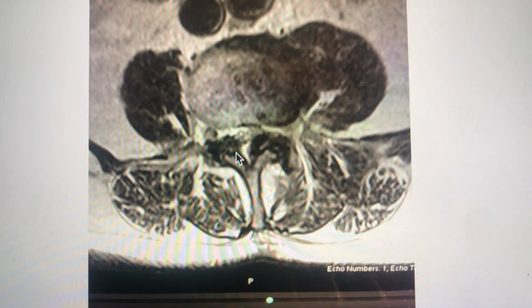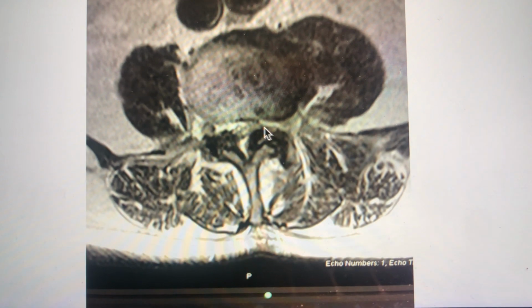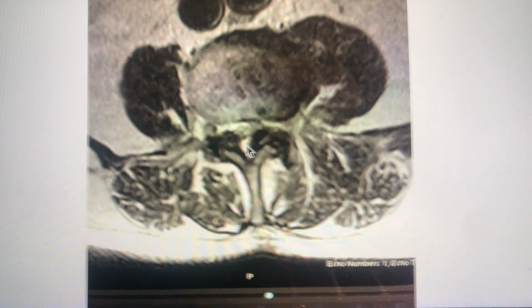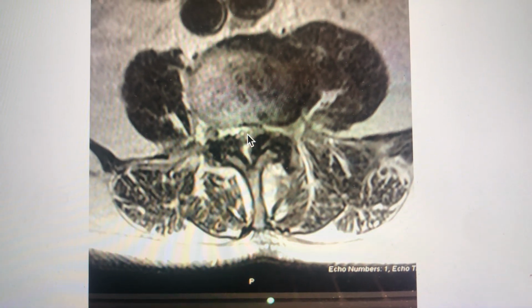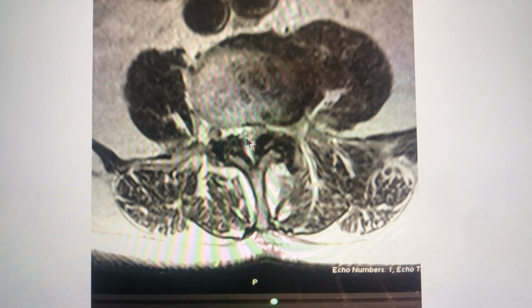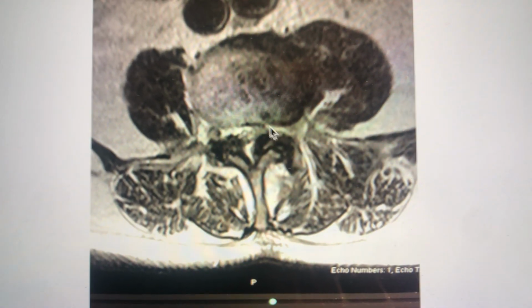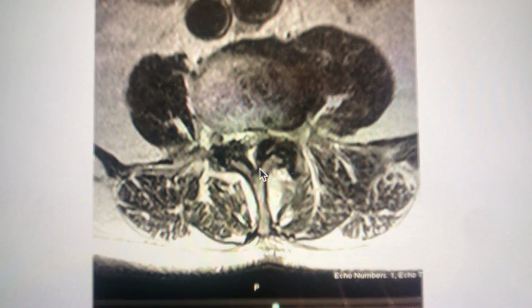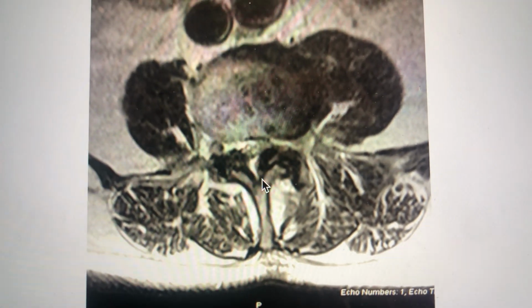She has joints that are enlarged here and ligaments that are enlarged here and on this side as well. The white space that we saw in the other sagittal images is now very small in here. It's very narrow. These little dots right in here are the nerve roots. It's easy to get them pinched throughout here, as this space gets smaller and smaller, or more stenotic. This should all be white in color here, but that's again another feature of the problem. That's all I have to show you on this particular patient.